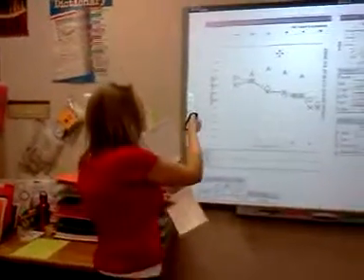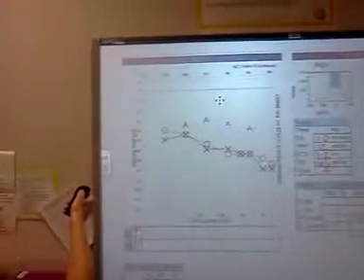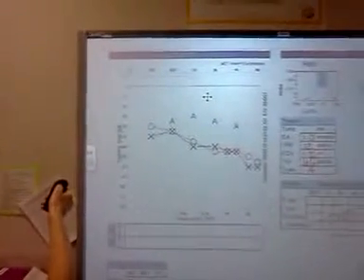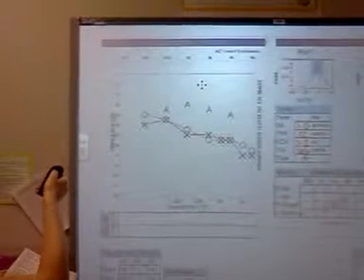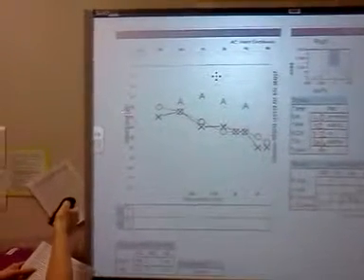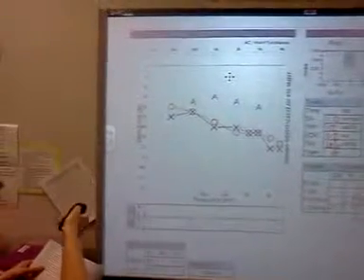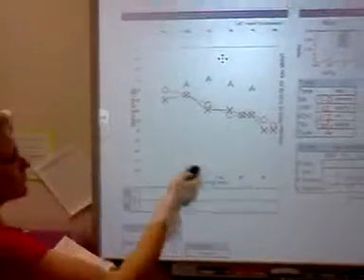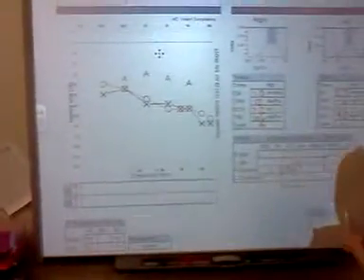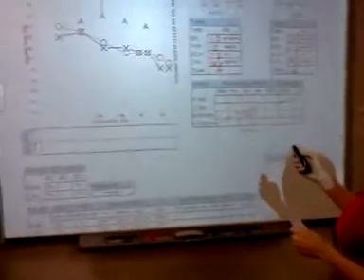First, on the vertical axis, which is right here of the audiogram, this is the level of volume, the loudness or softness that a person hears. The volume is measured in decibels, right here in dB, and the numbers range from -10 all the way down to 120. Going to move to a different audiogram.